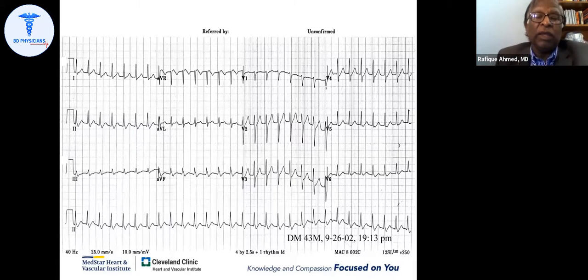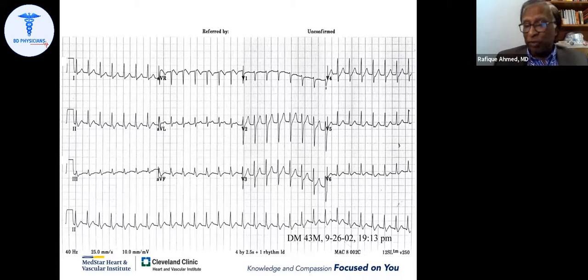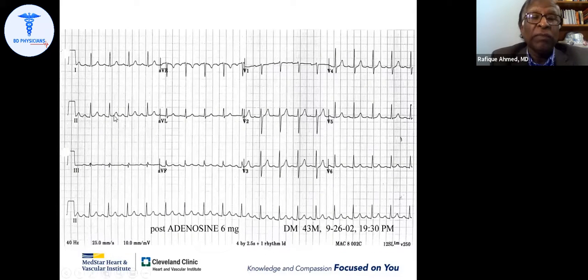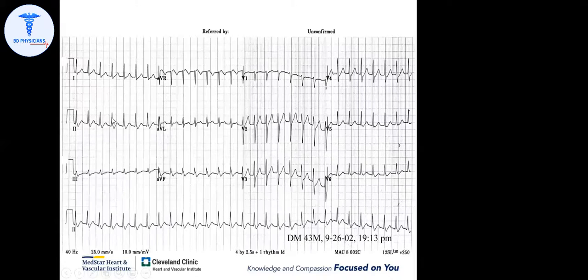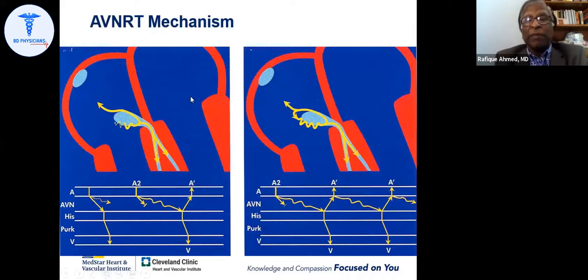Junctional tachycardia is a specific term that is seen mainly in pediatric patients after surgery. That's not very common in adults. I want another diagnosis. Okay, so AVNRT, re-entry tachycardia. Absolutely, AVNRT. So look at this. Same patient, when the patient converts back to sinus rhythm, you cannot see the terminal distortion. So you are very right to see this negative component here, and we cannot see it in any other place.